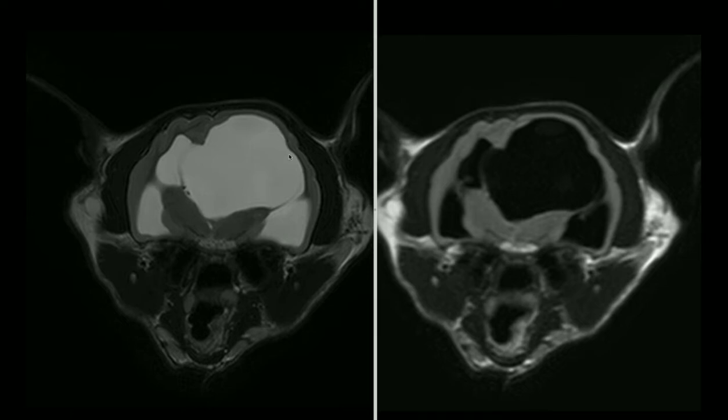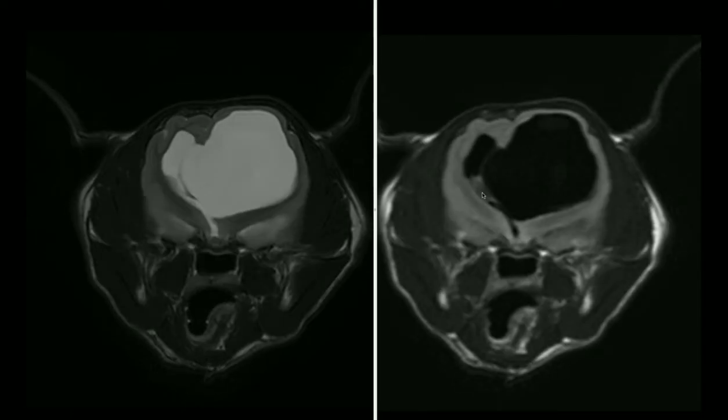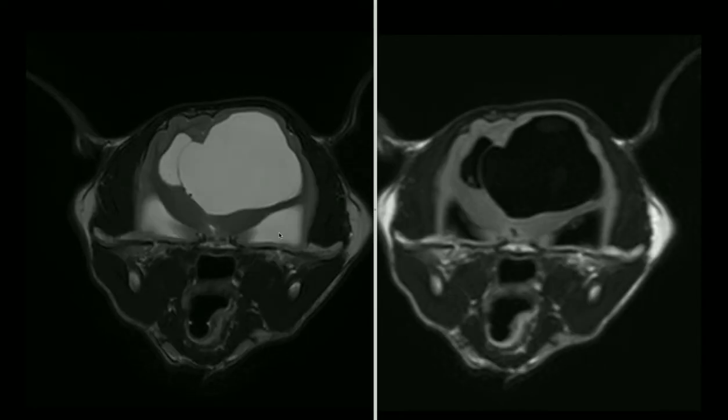dilated CSF space. The FLAIR obviously shows that the fluid here is similar in signal intensity to CSF because it's got good suppression. Some flow artifacts, which is quite commonly seen on the FLAIR sequence. So in these particular cases, when we suspect hydrocephalus, really the key is determining which of the CSF spaces are dilated and where's the cause of obstruction, if there is a cause of obstruction.